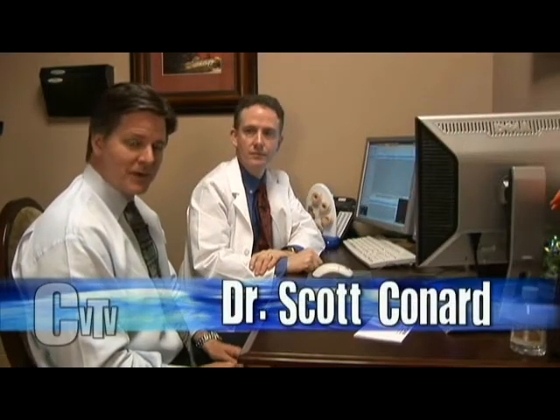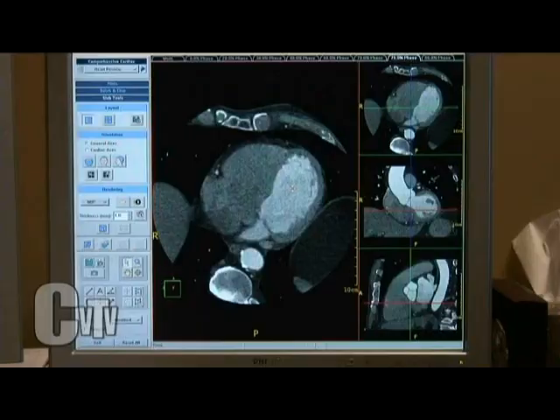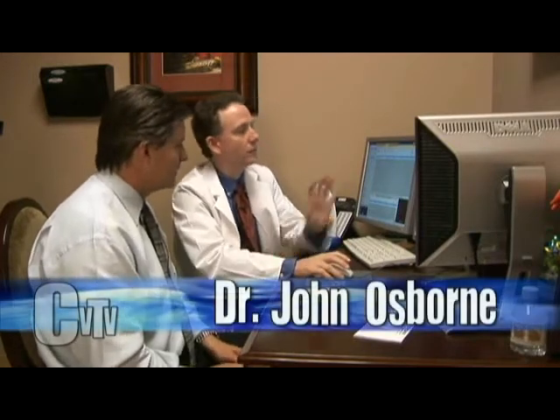I'm here today at State of the Heart Cardiology with Dr. John Osborne, and we're going to see what it literally looks like when you take a person's heart, bring that out, and look at it in three-dimensional form and see what's going on in the heart. Dr. Osborne's also going to share with us the other things that he can see on these very special images, called a CTA, or a CT angiogram. Dr. Osborne, thank you. Let me take you through this, Scott.